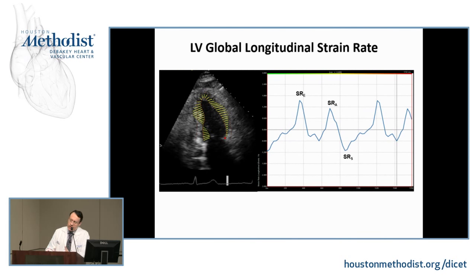You can do this with several software systems, if you would. There are efforts towards standardization of systolic strain, but little in terms of diastolic strain rate signals. And here it's showing you that with the VVI system with early and late diastole, and this is systolic strain. That signal can also be analyzed and has relations very similar to IVR in terms of direction, but magnitude not as tight.